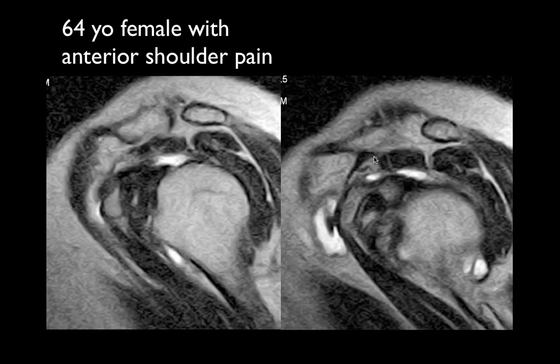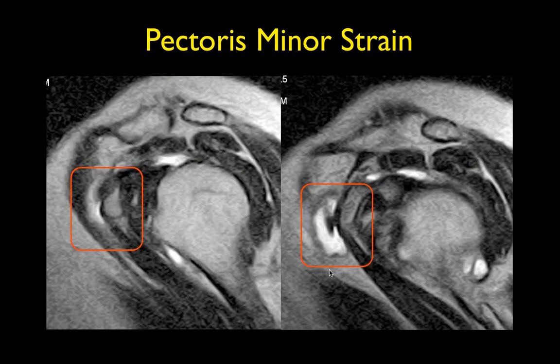Okay, here are the sagittal images. Oh, what's this right here? That looks like it's the short head of the biceps. Biceps muscle? Yeah, the short head of the biceps comes up and attaches to the inferior coracoid tip. Oh, okay. So what's happening over here? So then it looks like there's some fluid that's coming up into a partially ripped tendon, and the muscle is strained. Okay. So this is actually the pectoralis minor. Oh, okay. Not commonly torn.